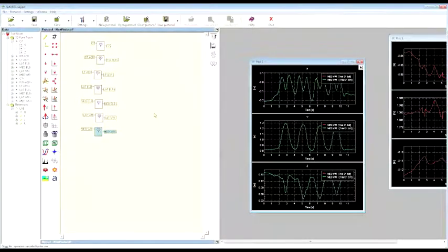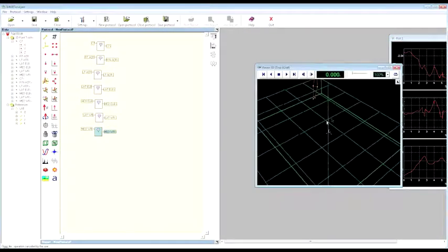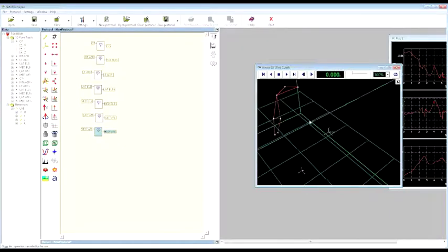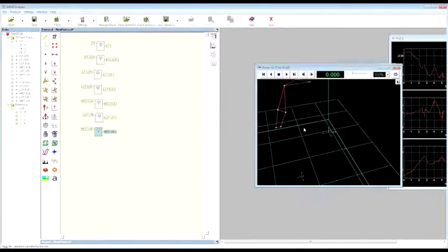Okay, so after you have performed this operation, we can start by computing our 1D angle to perform the analysis that we want to perform, that in this case is about the computation of the flexion extension angle at the elbow level.